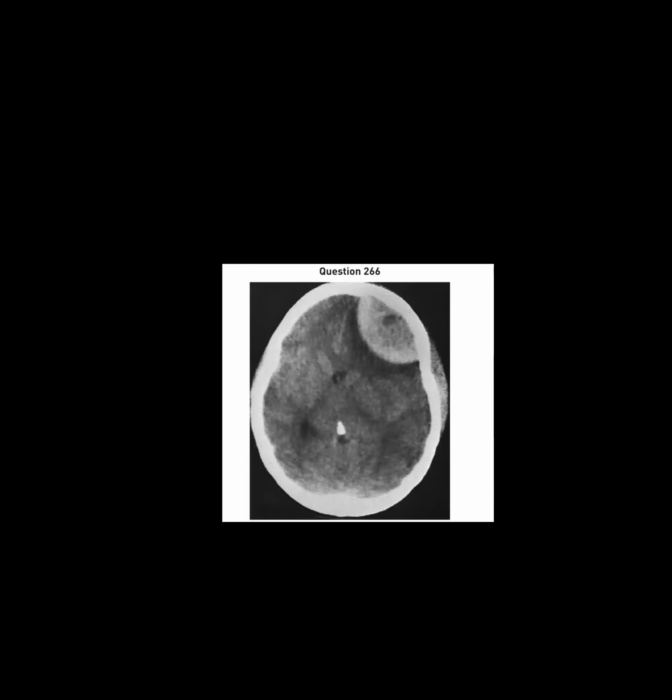This is a companion case from your prior in-service. If you look at this, there's this lentiform hyperdense collection over here. This is an epidural hematoma because it stops at the suture over here, the coronal suture.